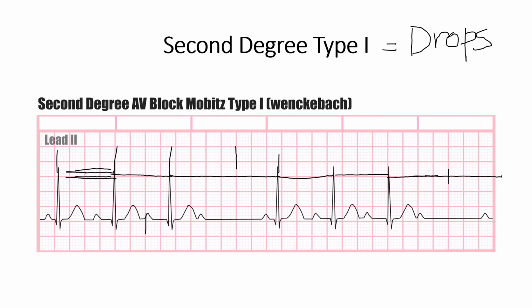I would like it right here, if I can have it there. I think you guys get the idea. Let me see if this is better. Okay, right here is where we want to be. Good. Right before that inflection point, and you guys can see that.